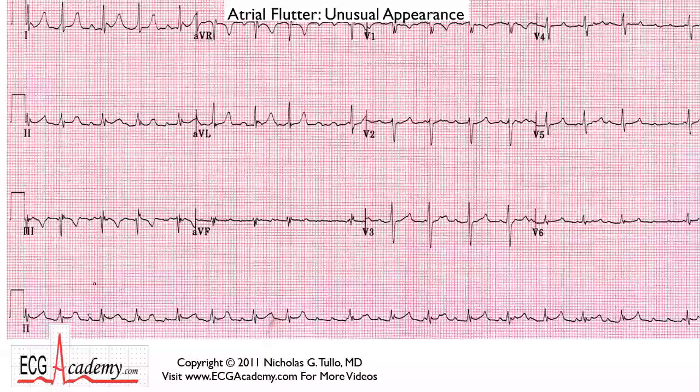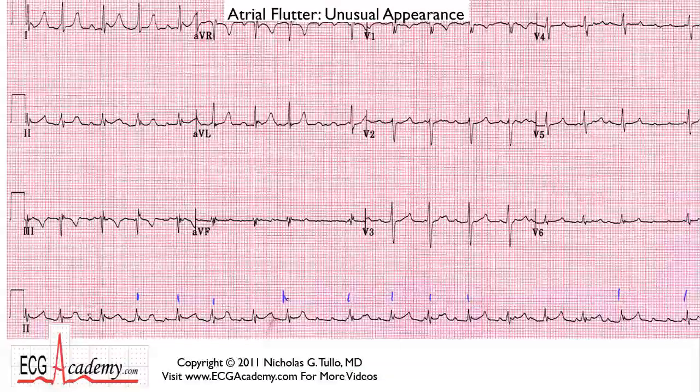Now in this 12-lead ECG, if you scan the forest, you see that the QRS complexes are irregular. And there does not seem to be any specific pattern. Some of these complexes are fairly fast, about 100 beats per minute, and this one's a little bit faster, about 120. And then you have a little break in the action. It slows down briefly, and then it speeds up, and then it slows down again towards the end. So there's no pattern to it. It seems to be irregularly irregular, and that makes you think that there's some kind of atrial arrhythmia going on.